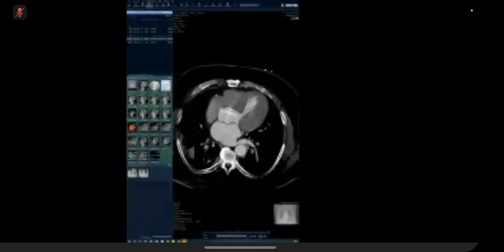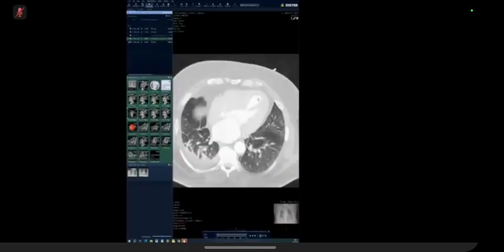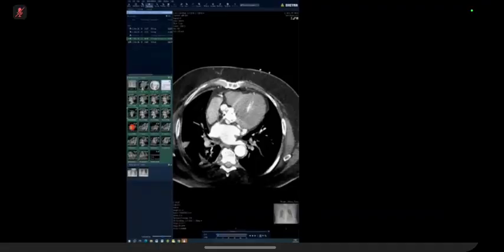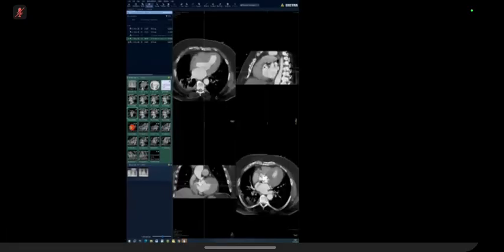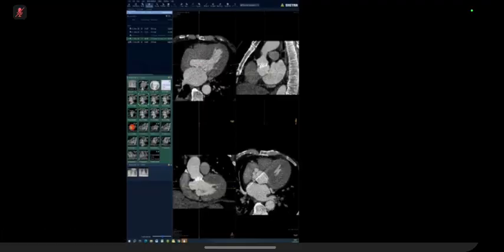I told you the patient has an aortic valve replacement, and the patient has an abnormal echo and is in heart failure. You see the heart failure changes with a bit of pleural effusion, some septal thickening. So focus on the heart. There is left ventricular hypertrophy seen. The patient would have that anyway if they had aortic valve disease that was subsequently treated. I'll give you a cardiac MPR view.